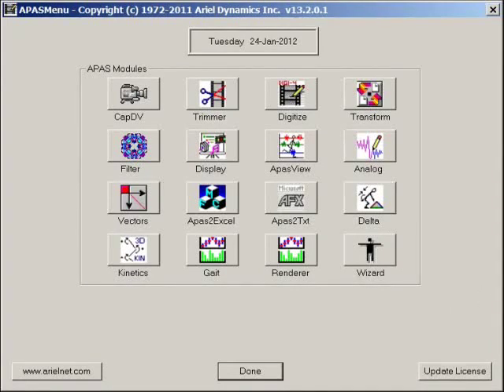The first process in motion analysis is to capture data, video data. And there are two methods of doing it: using markers for automatic digitizing and using manual digitizing, especially when there is no choice to put markers on the athletes. In my example, first I'll use manual digitizing with an Olympic athlete, a discus thrower, that we did the project on at the USOC in Chula Vista, San Diego.